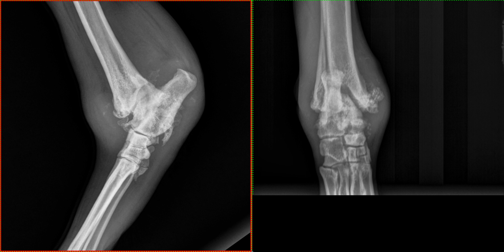So what we then deduce is that there's both marked intra and extracapsular changes of the left tarsus in conjunction with the subtle subchondral cortical lysis, which heightens our concern for a septic process that summates with the chronic degenerative changes. Septic arthritis cannot be excluded in the right stifle and should be considered as a differential given the reported clinical symptoms. However, there are also marked arthritic changes. These changes can be due to the previous cranial cruciate ligament rupture and secondary TPLO.